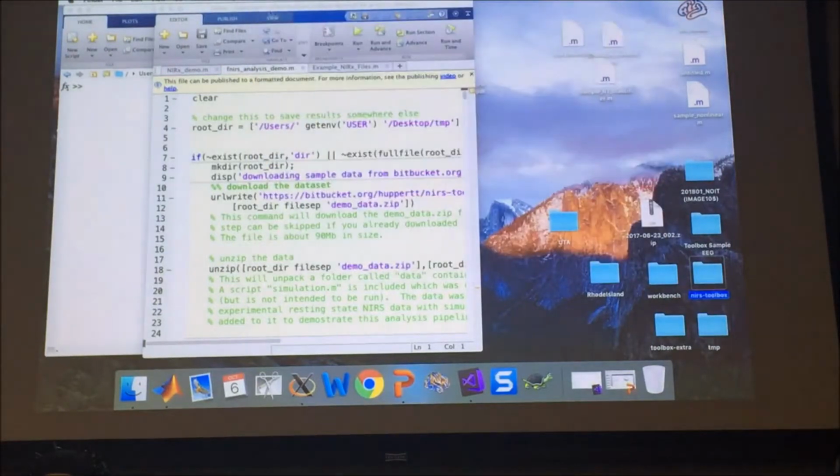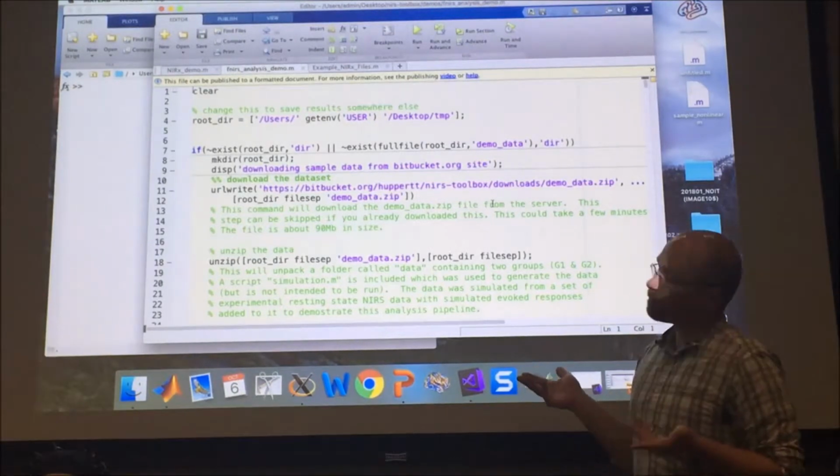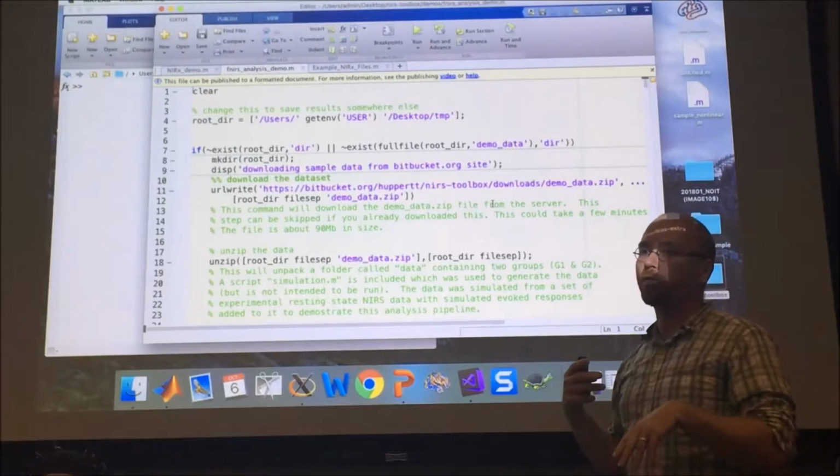So anyway, this one here, let's see if I can expand it. This is actually the NIRS analysis demo. This is the one I said to start with. If you open this up and just click this run button up here, it'll actually run the whole thing. You don't have to worry about it.